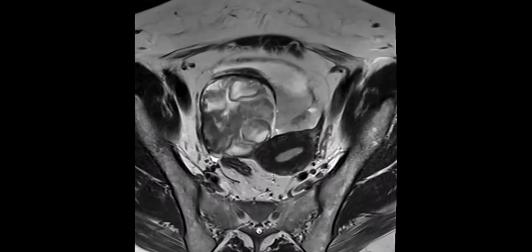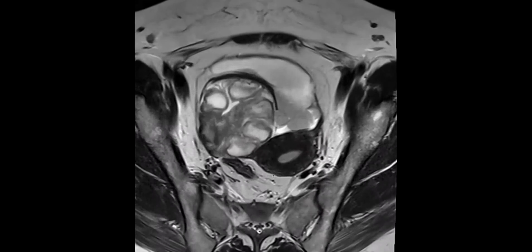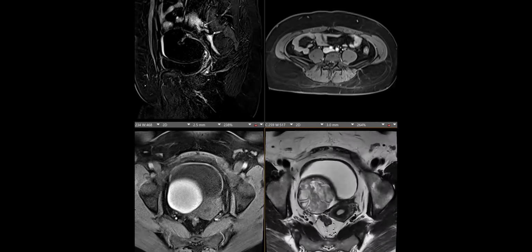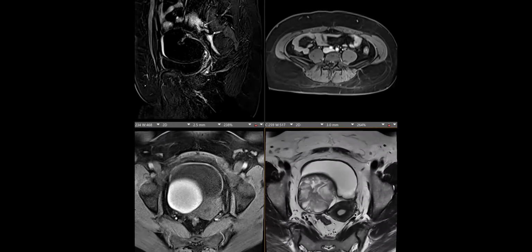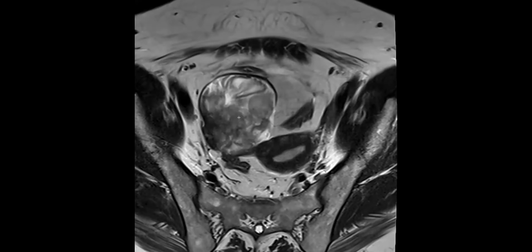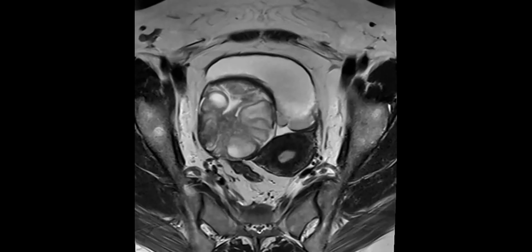So this turned out to be the ovary. So this is an example of a hemorrhagic infarction of the ovary. Patient had IVF before, and she had deep infiltrating endometriosis that was kind of covering this area, like the right adnexa broad ligament. And we think both a combination of the IVF treatment as well as the underlying deep infiltrating endometriosis caused this to become chronically torsed and then infarct.